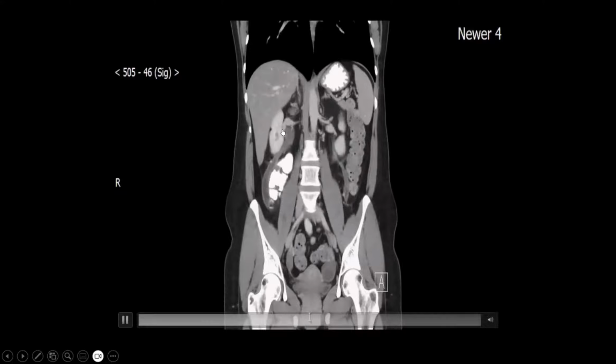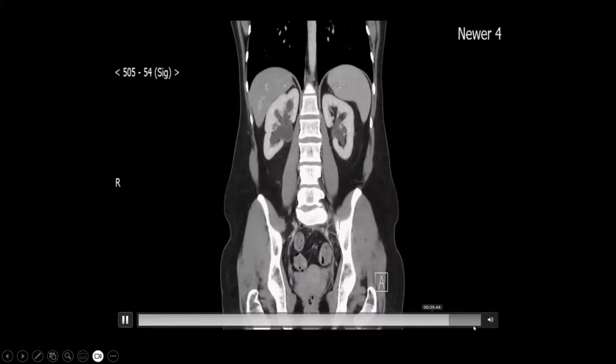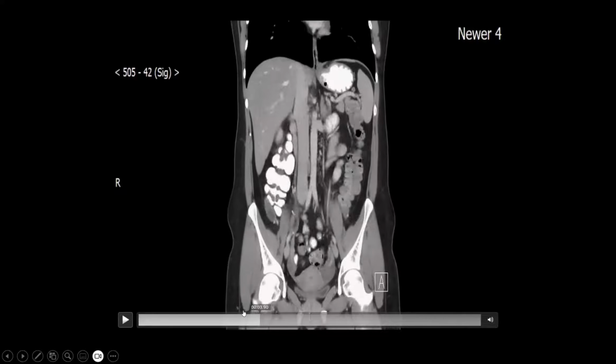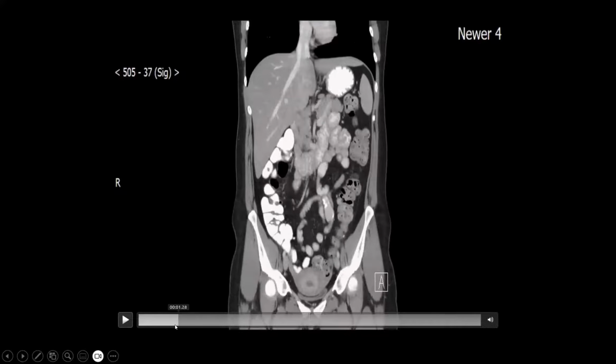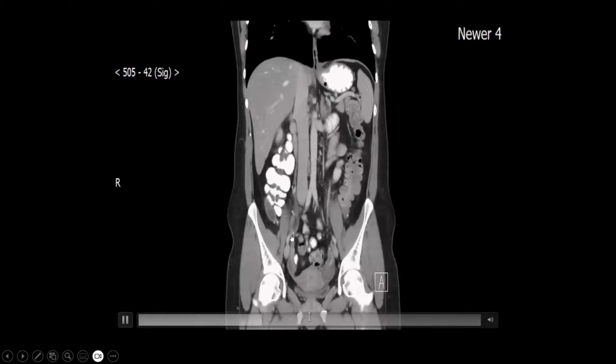So that's the ureter. Okay, and then just where does it insert? And it's inserting normally in the urinary bladder. So the thing is, it's not congenital. It was surgical. Oh, that's appendix. Appendix is right there. Okay, good. Yeah. Appendix is fine. Cecum is fine.